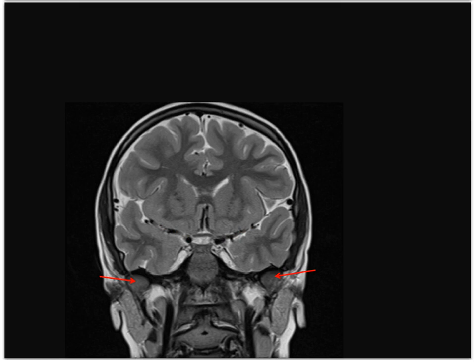This is a good place to stop and get ourselves oriented. The structure marked with the arrow is the condyle of the temporomandibular joint. Place your fingers just in front of your ear and feel the bony prominence of the temporomandibular joint condyle. This is the coronal plane between your fingers where the structures shown in this image lie within your own head.